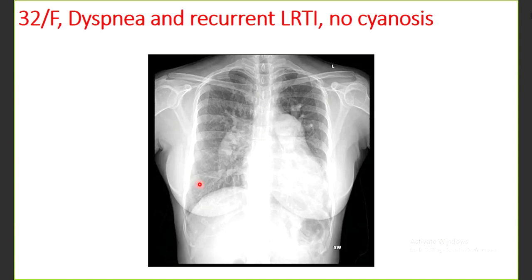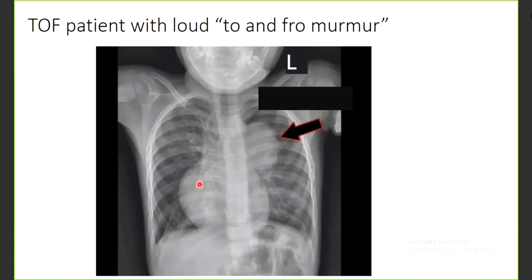This patient's X-ray findings are consistent with a large pre-tricuspid shunt that is amenable to closure and no evidence of pulmonary artery hypertension.